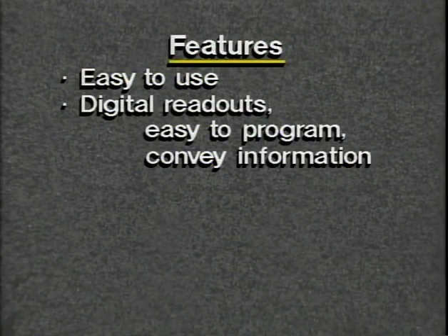Now, in the 90s, advanced technology offers the benefits of infusion pumps. An infusion pump is an electronic device that exerts pressure on the tubing or fluid to maintain a constant, pre-selected rate of administration of solutions and medications. Home infusion pumps are lightweight, reliable, accurate, and cost-effective. The pumps are easy to use. Almost all of them have digital displays.